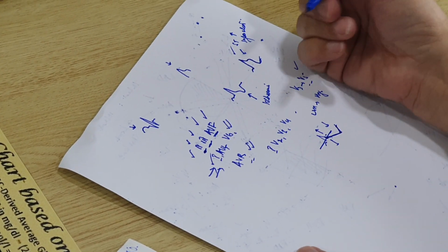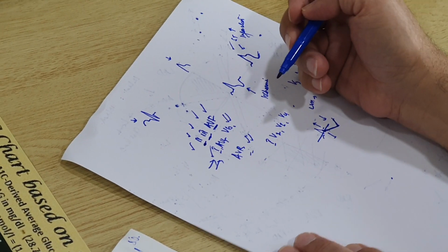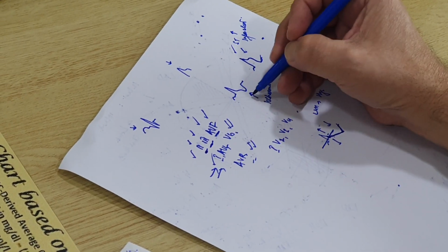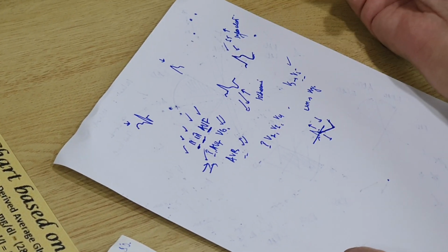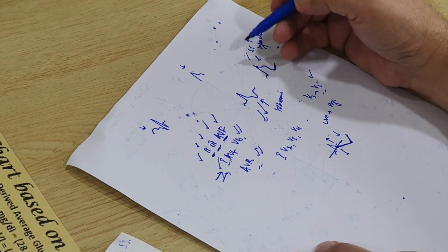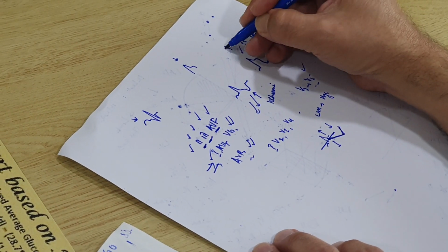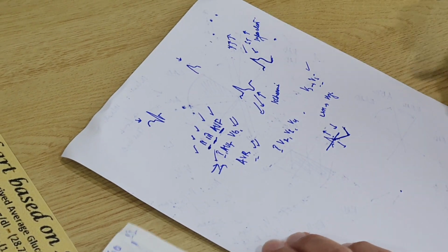But as I said earlier on, remember, the T wave is going to run away from the area of mischief. So if it is the inferior wall, the T wave will run away, so it will be negative. If there is infarction, the ST segment will be sucked towards the area of mischief. So you will get ST segment elevation in those areas.